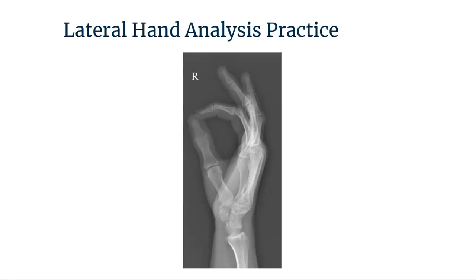Take a second to review this lateral hand analysis and then complete the next question.